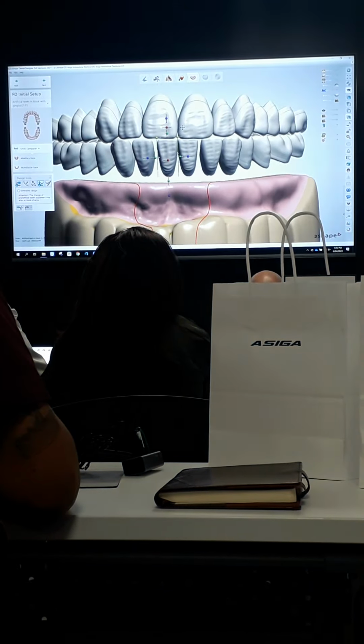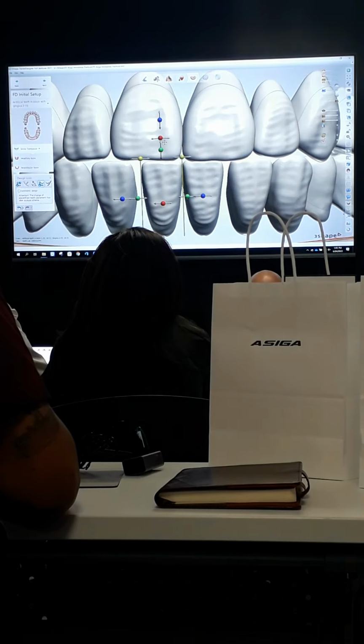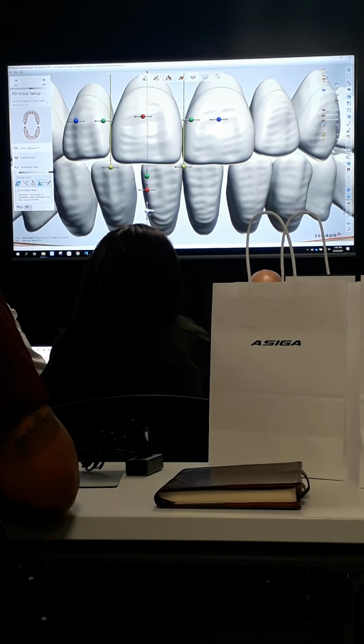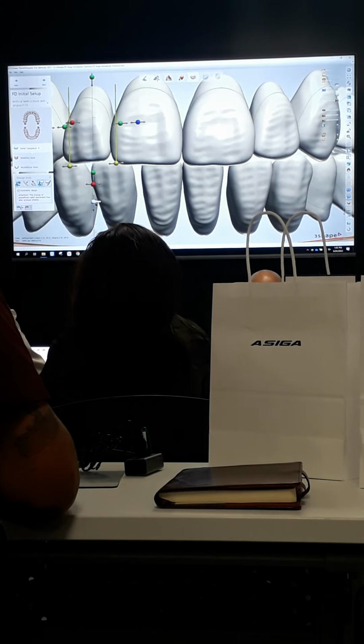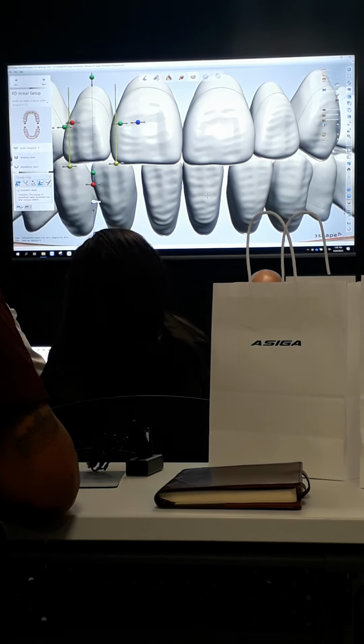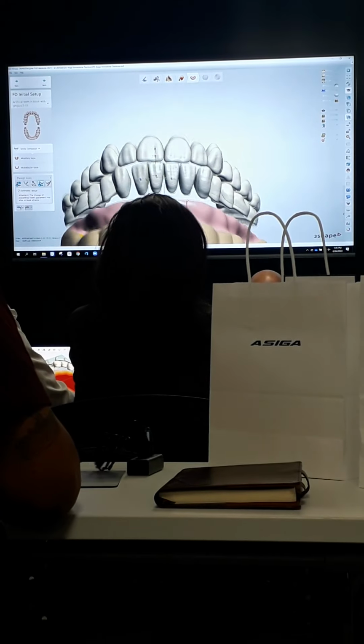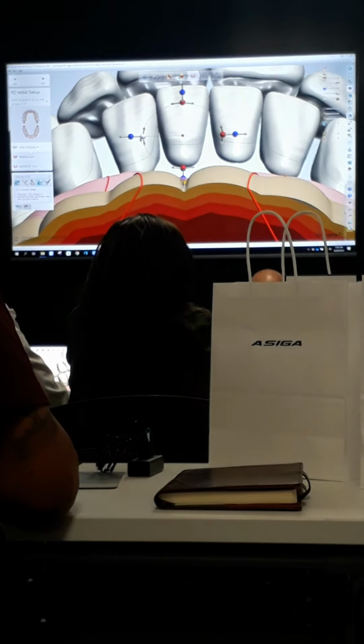And now I can see that it looks to me like my uppers are kind of too high. So I'm going to come here, turn on my symmetric design, just drop those down, do my laterals as well. And then just continue around, making sure that I have the right spacing here.